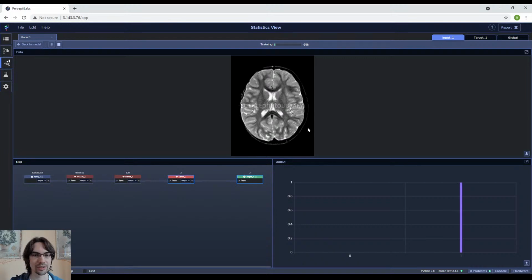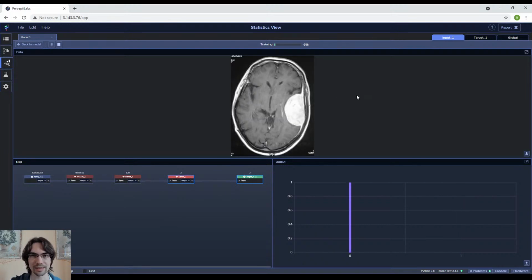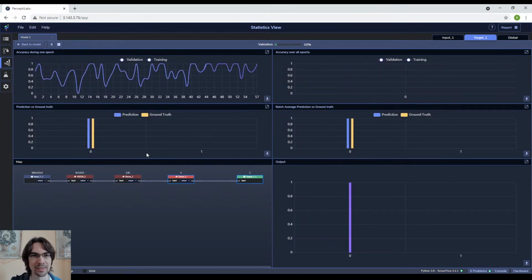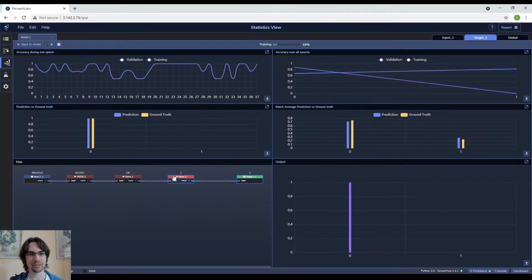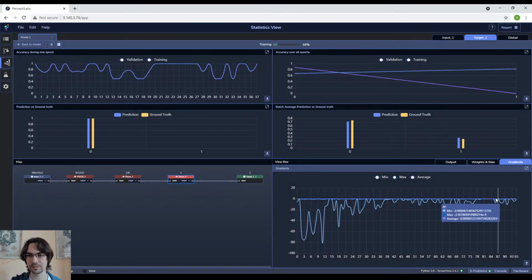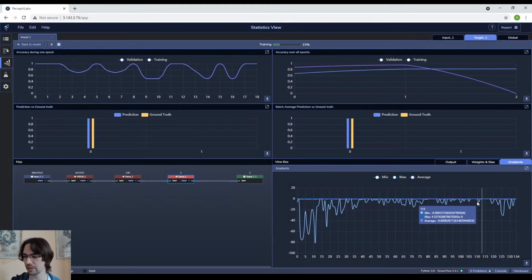All right, so it starts running, and I never noticed that there was a label in front of that before, or a text. That should be fine. All right, so this is how it looks. Let's quickly swap over to gradients, see that they are not 0. If they aren't, or they get very close here.